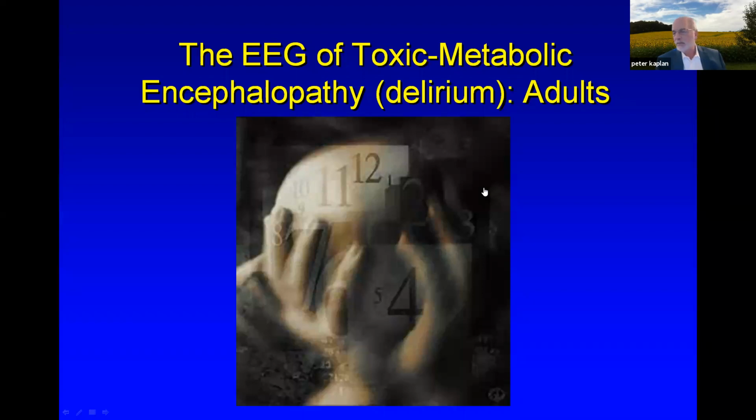So that would be intermittent bursts would be probably a better way of describing it. You have to add the word generalized synchronous bursts, though. Burst suppression is always bilateral synchronous.